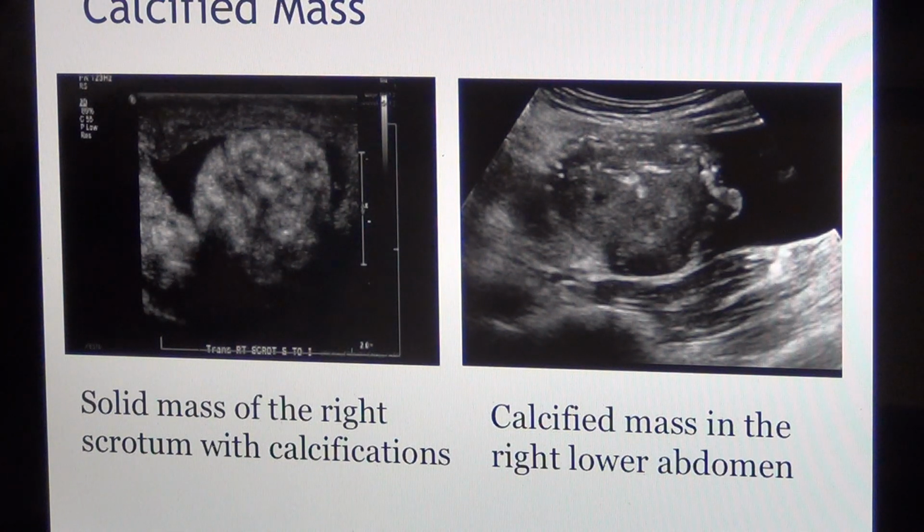So it's better to remove it. If not, then follow up. And also keep that in mind. If it is a calcified mass in the breast, and you know the breast microcalcification is precancerous. So if it is in the breast, I will not keep it.